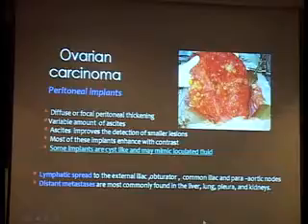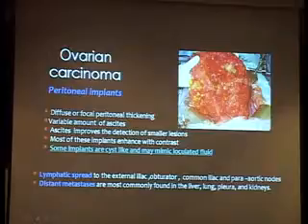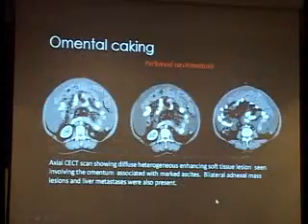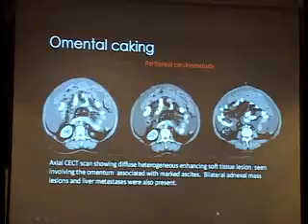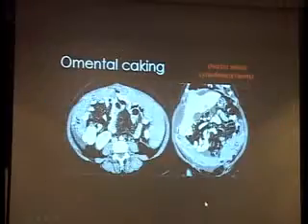Ovarian metastases usually go to the peritoneum and they initiate the presence of ascites, and ascites is one of the helpful tools to detect the peritoneal deposits. And you know that the omental cake or the massive peritoneal metastasis will appear like this, a big soft tissue mass underneath the anterior abdominal wall, then you see the presence of ascites as well.